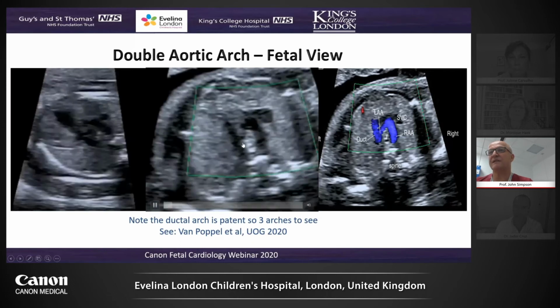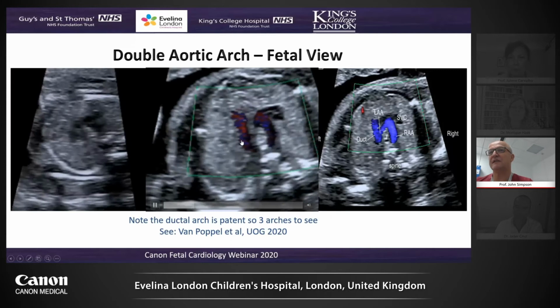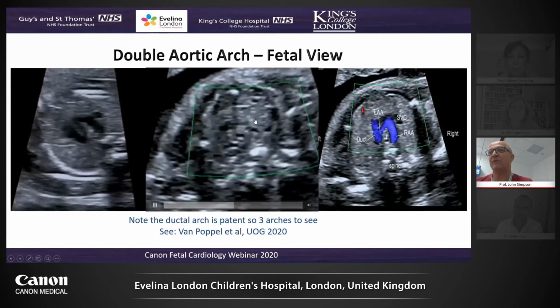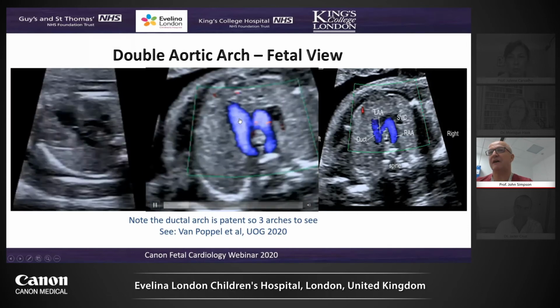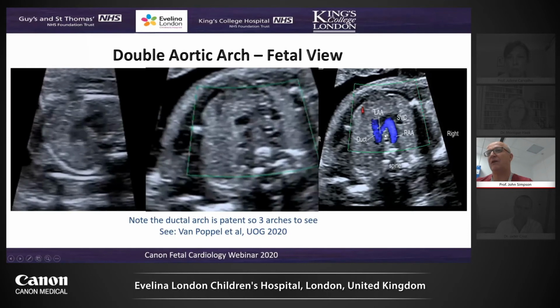And this is something, if you want a sort of pattern to look at, you see a sort of Z with the pattern that these arteries make, with the right arch, the left arch, and the left duct. And this is just a labeled version of the same image.